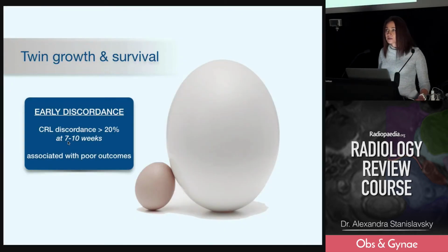Okay. So we look for discordance in twin pregnancies from very early on. And early on in the first trimester, CRL discordance of more than 20%, and in some papers even more than 10%, is associated with very poor outcomes for the smaller baby. Later in first trimester, this also applies, but the sensitivity and specificity isn't as good. But certainly you should be reporting twin discordance in early pregnancy, particularly early on.